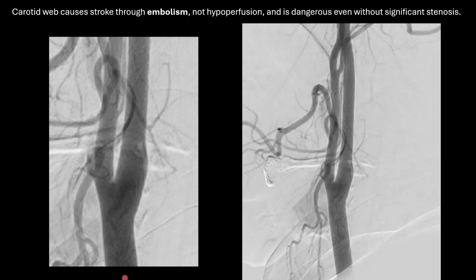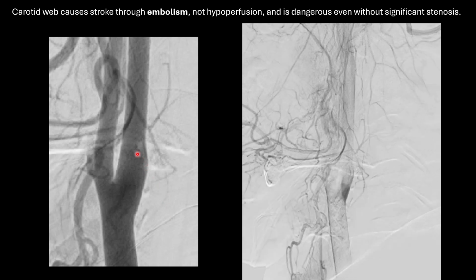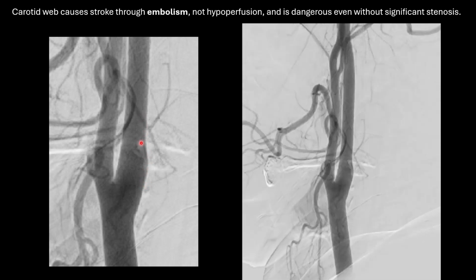This was the MRI. These are the DSA images. Let me just run the video. Here we are able to see the right ICA, and there is an area of shelf-like defect arising from the posterior wall of the right internal carotid artery. There is a small thrombus adherent to the superior part of the shelf. This is basically a carotid web, and this is the thrombus which is adherent to the superior aspect of the carotid web.